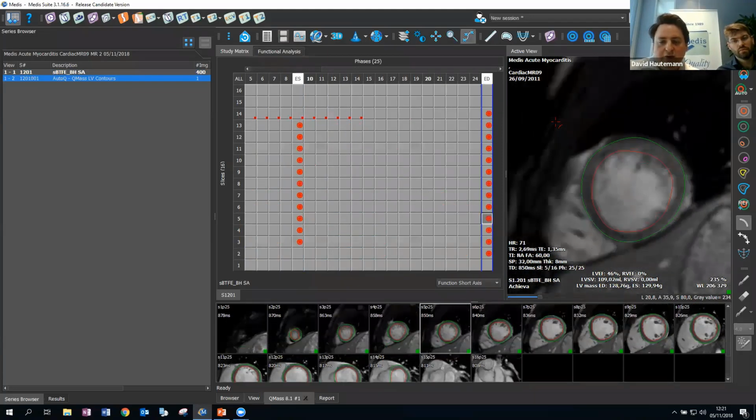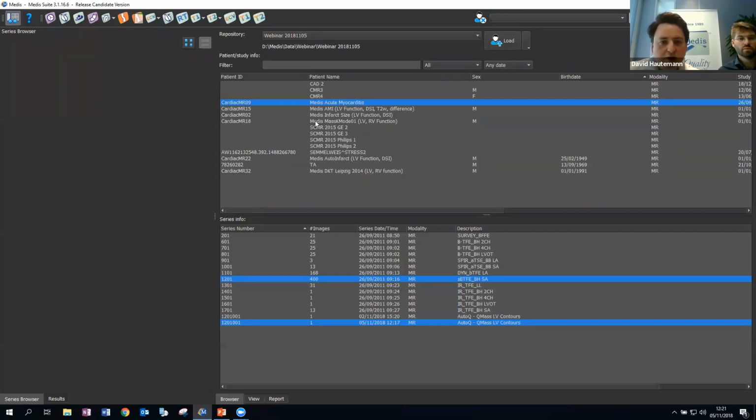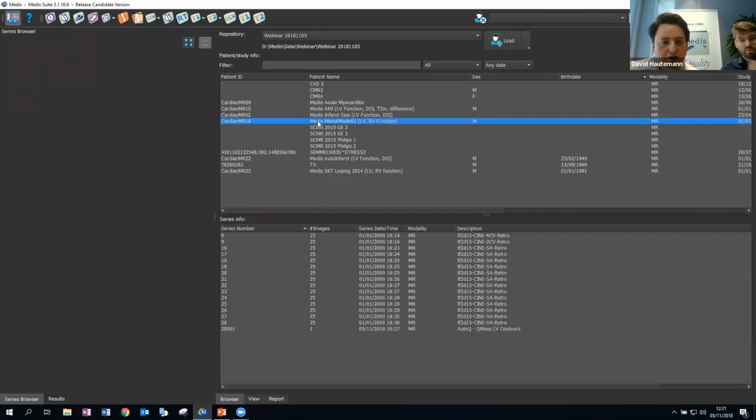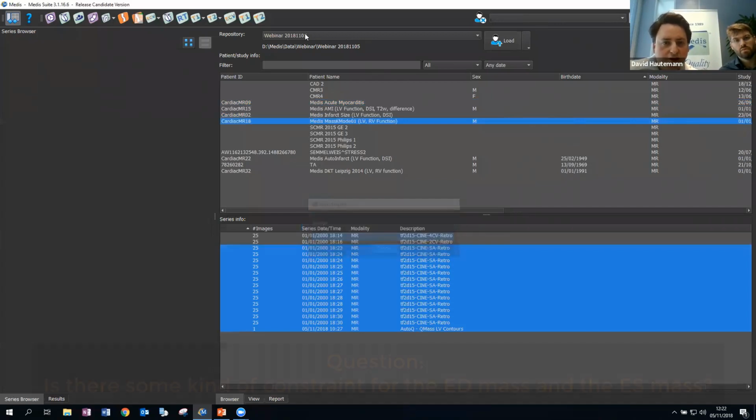All right. So it has been trained exclusively on adults. Will it work for pediatrics or congenital? It may not yet work that well on that. We are in the process of trying to make it suitable for pediatrics as well. We're looking into whether we can use the algorithm. I have here a case of a tetralogy of Fallot. I think there's a question.